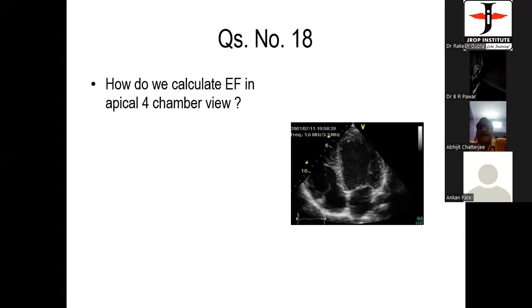Dr. Hiru, see, I want to measure the left atrium. Yes, sir. In which part of the cardiac cycle do you measure the left atrium? Is it systole or diastole? Sir, we will measure it in systole. And how do you know that it is systole? Sir, as both AML and PML will close. Okay. And how do you know that the left atrium is enlarged or not?